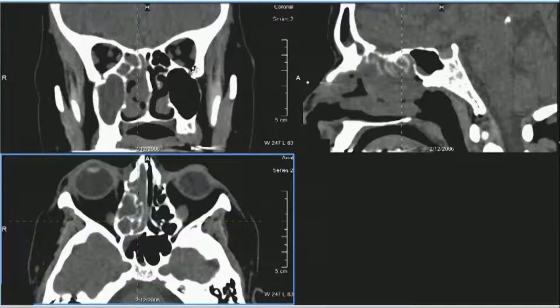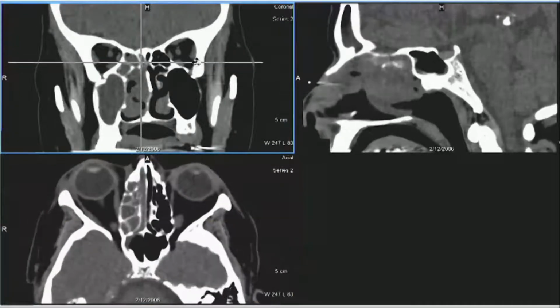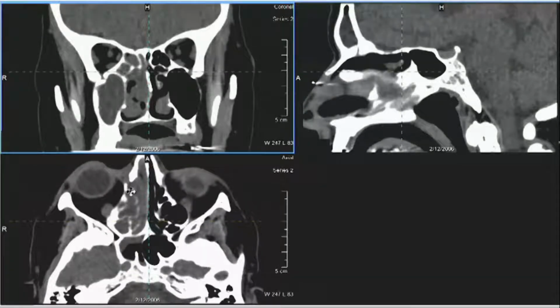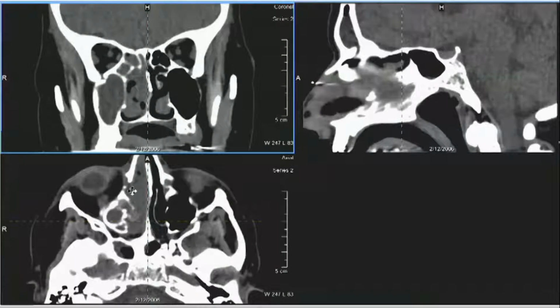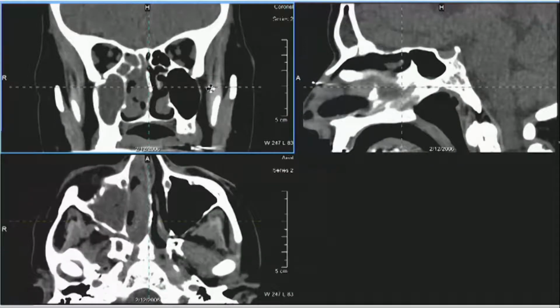The analysis of this case should follow a logical pattern, evaluation of certain anatomic structures. Beginning from the top of the ethmoids and panning inferiorly, the first checkpoint going from superior to inferior is the preseptal soft tissues in the region of the lacrimal sac, which are too prominent on this side compared to the other. And there is a suggestion of some bone loss at the junction of the lacrimal bone and anterior aspect of the ethmoid bone. That abnormality or difference within the lacrimal sac region seems to persist, and as we go inferiorly, the preseptal soft tissue swelling thins out a little bit.